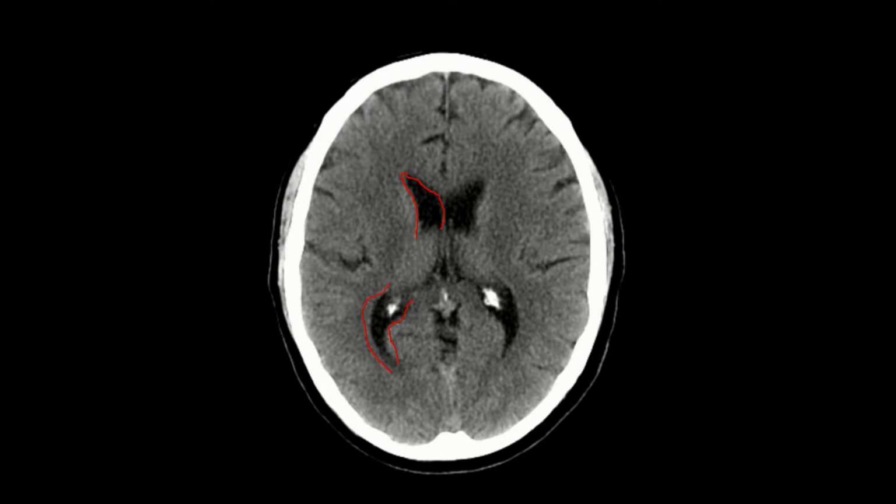is the lateral ventricle. If you remember from anatomy, the lateral ventricle is kind of arched, and as we take a transverse section, a portion of it will not be seen. So let me draw that. Assume it's like an arch. If I were to take a transverse section, you would not see part of the lateral ventricle. So you're seeing the anterior end and the posterior end, but not the middle right here in this particular section.